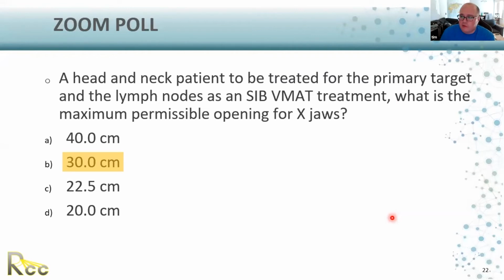And how do we include it? Do we include it in the body contour, or are there other ways to account for the couch in the plan? So what we do for the couch itself, we don't include it with the body contour.